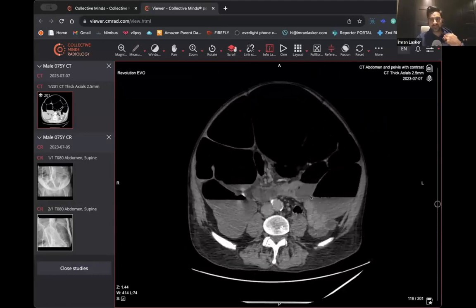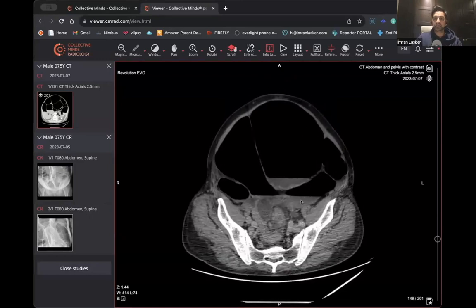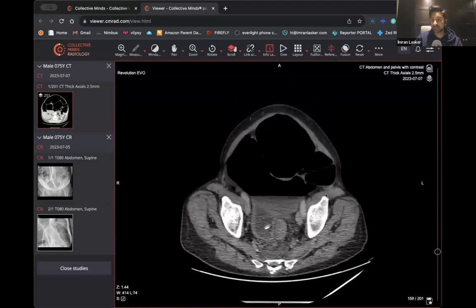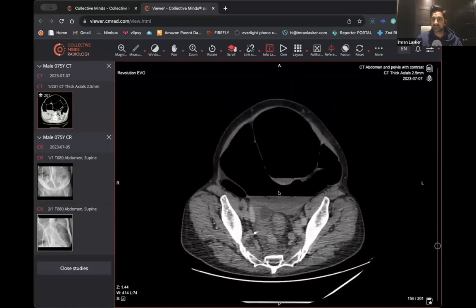And so whenever you see any dilated bowel, go for what I've said. First things first, go for the hernial orifices. Once you've done the hernial orifices, look for any hernias anywhere else in the body, and then just go for a sigmoid volvulus. What you need to do is do the coronal views and have a look for that whirling sign. If you haven't done that, then have another look at the whirling sign on the axial views, and you feel like you can see it just around there.